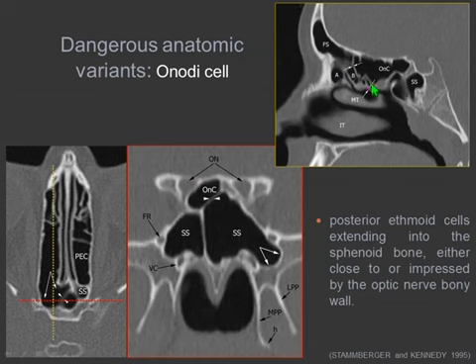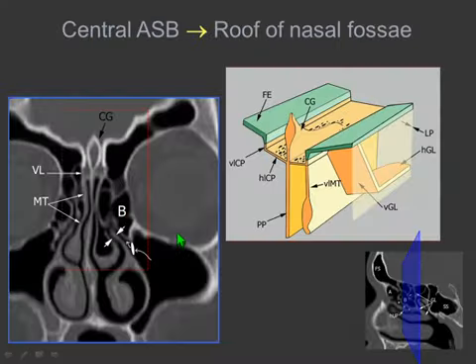One is the sagittal, the other is the coronal, because any horizontal lamina dividing the sphenoid sinus in two different parts is something that you have to check to exclude the presence of Onodi cells on top of the sphenoid sinus. And of course, on the horizontal plane, you are looking for the continuity of the posterior ethmoidal cells, and if, like in this case, you see that the cells are reaching the sphenoid sinus, this is the reason why you should suspect this condition.